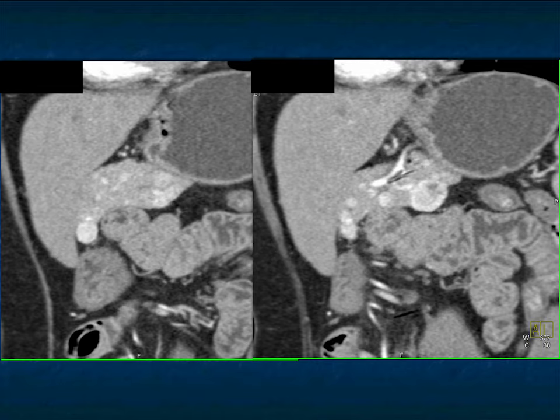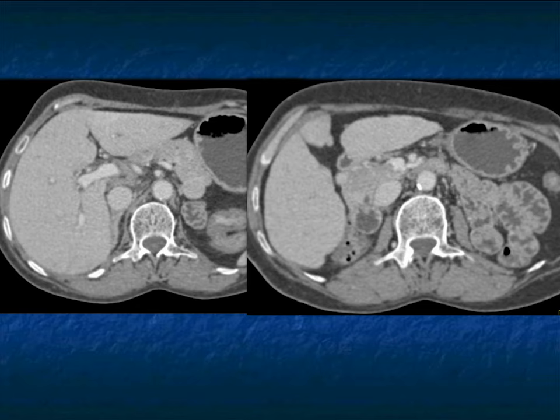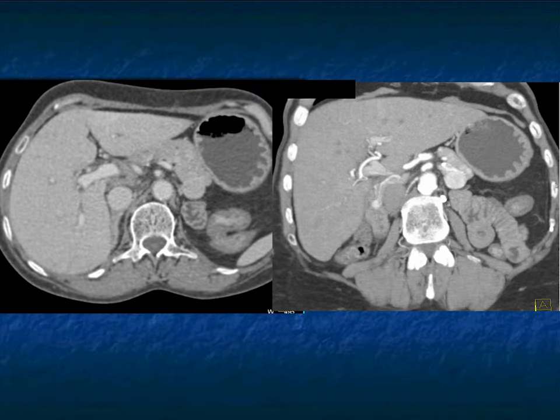Renal cell can present with GI bleeding, so that's something else to think about. And in the venous phase, you can see how the lesions, including here, are difficult to see. That's the lesion, but it's washed out. The lesions in the head of the pancreas, the nodal lesion, the lesions in the duodenum, all wash out substantially by the venous phase imaging, and that indeed can be a challenge.